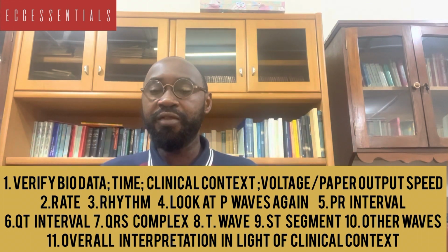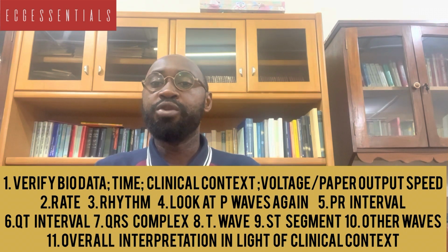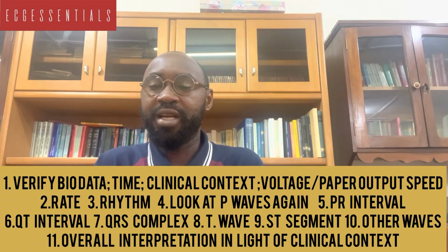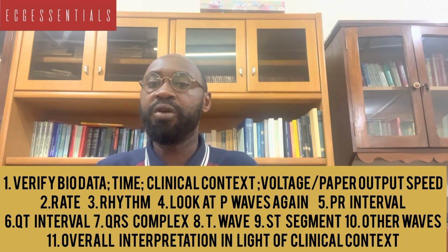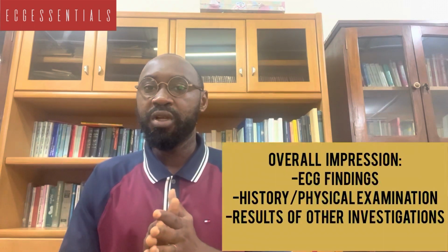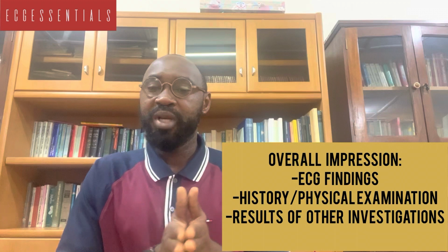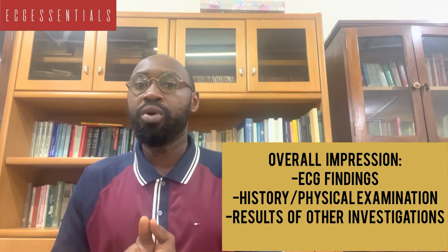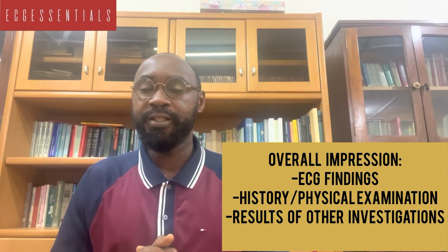When you have done everything, then you are ready to put your interpretation into context. That is, again revisiting the clinical presentation of the patient. So the overall interpretation will be all the information you have put together from this approach that we have presented, and your history and physical examination findings.